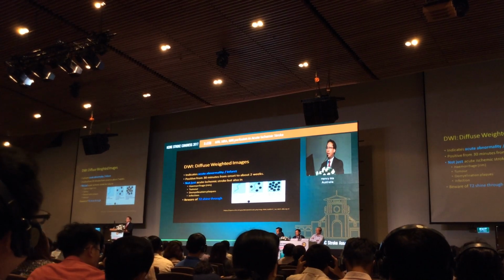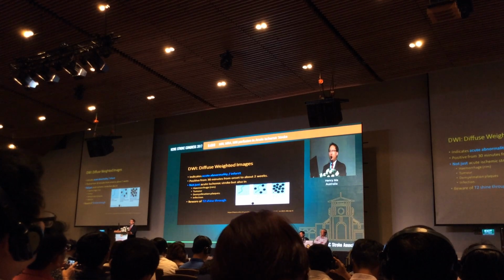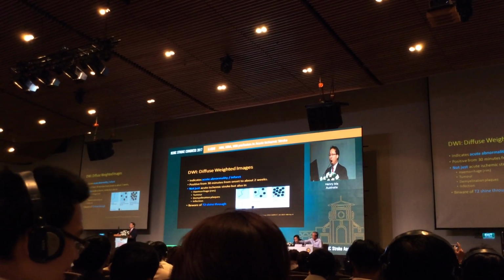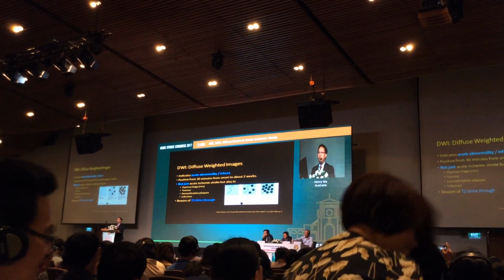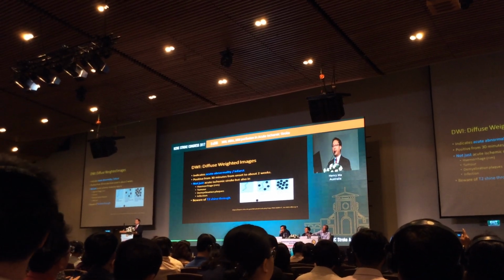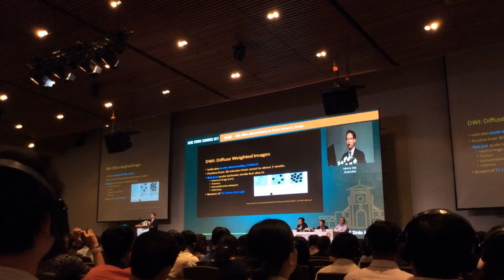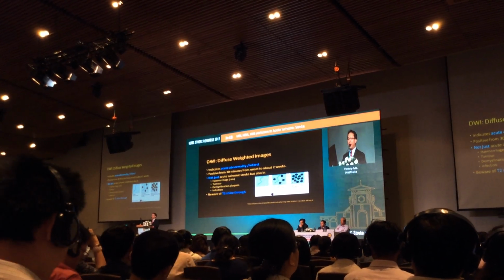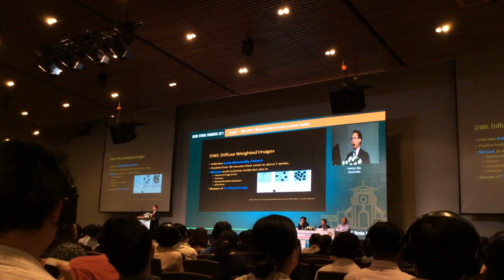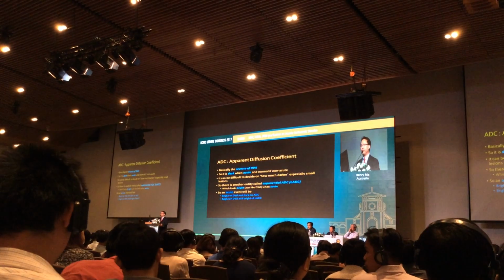So firstly, DWI. Most of you would know DWI equals acute infarction, but all it actually means is abnormal water molecule movement. So anything that affects tissue molecule movement can look bright on DWI, such as hemorrhage, tumor, demyelination, infection. They can all look bright on DWI. I'll talk to you about T2 shine through a bit later. What I'm trying to get you to think about is the use of it, but also the pitfalls of these sequences.